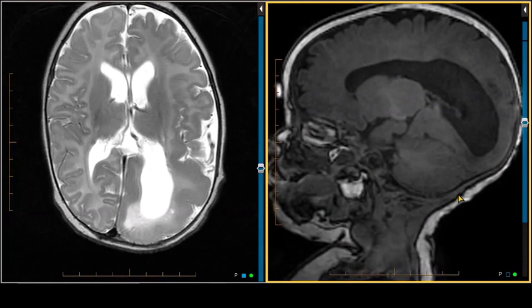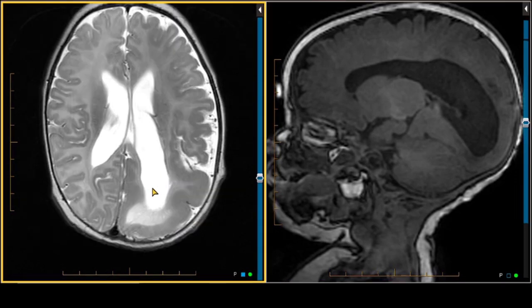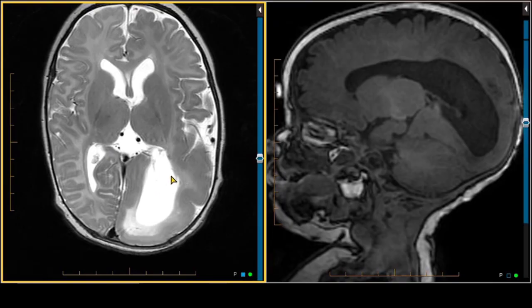This is an MRI scan of the brain in a 2.5-month-old child with severe seizures, predominantly affecting the right side of the body. Immediately, we see several abnormalities. First of all, we see an asymmetry in the size of the left hemicranium. We can see here the left hemicranium is larger than the right. The left cerebral hemisphere looks larger than the right. The left lateral ventricle, especially posteriorly, looks larger than the right.